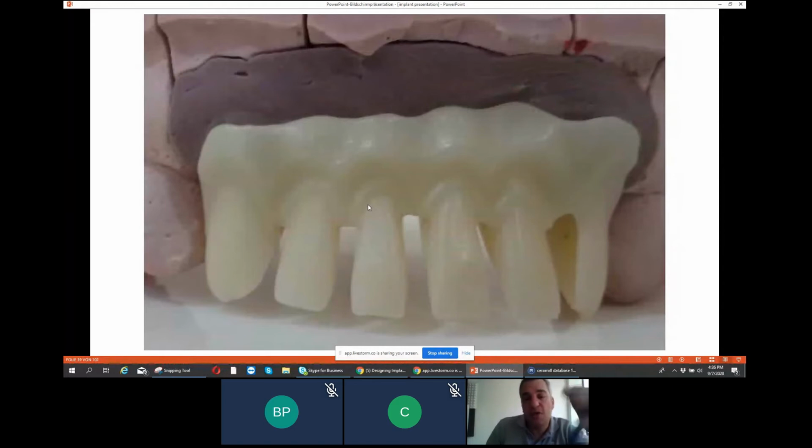In this picture, I used a wax bridge where we are trying to check if everything is working properly. I was in a lab checking this, and I used this picture. That's why I don't have enough time to make zirconia and finish the workflow and then try it. I did it in wax just for demonstration and to show you how it works.